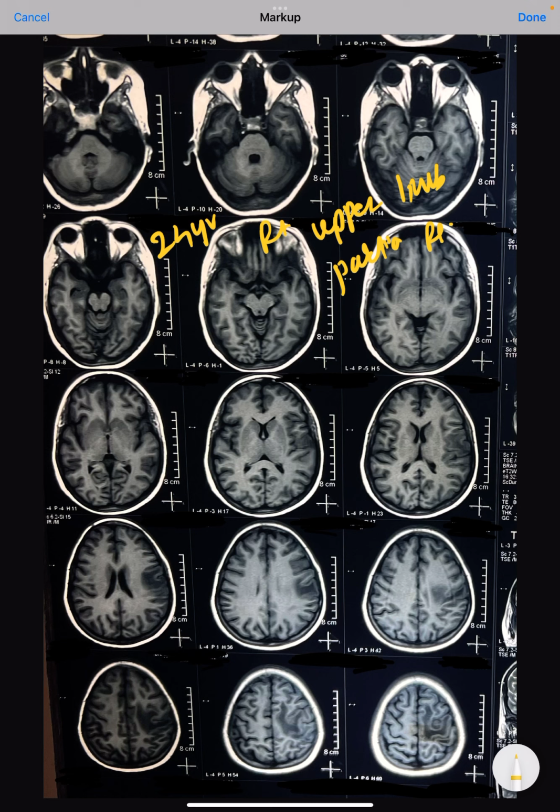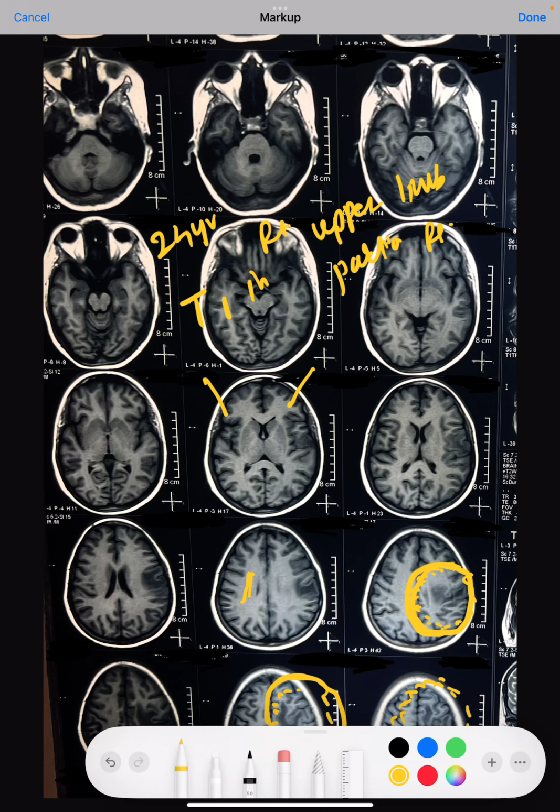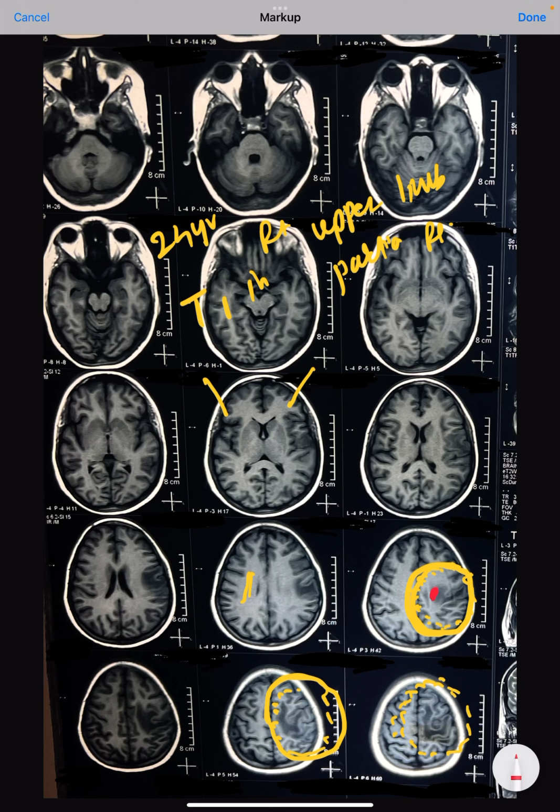Now, this was a plain MRI. This is a very typical T1 image. When we compare the right side and the left side, we can very easily make out that there is some problem here. So this is a plain T1 weighted image, and in this area on the left side there is reduced signal. We can see that this is very typical of edema. On the right side there is nothing, but on the left side there is something over here, most specifically in this area.